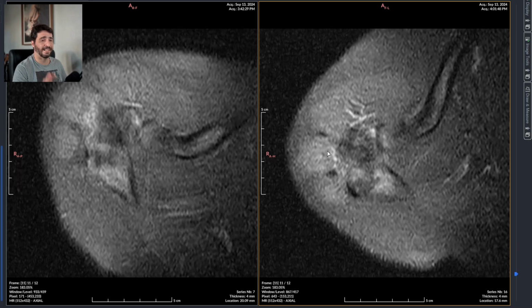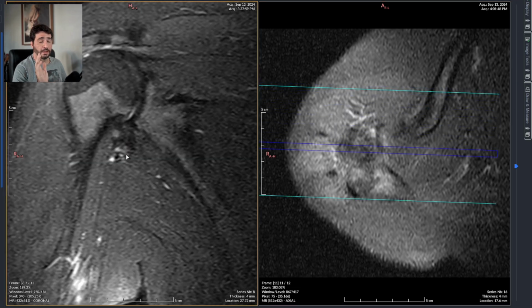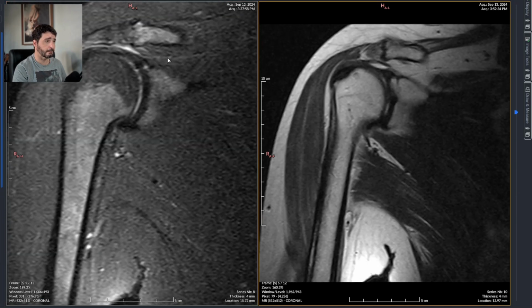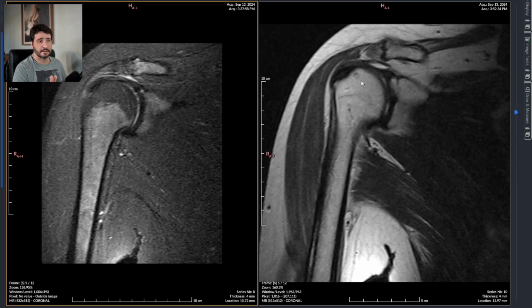So I have no signs of posterior nor anterior dislocations, no signs of fractures nor bone contusions, bone edema. So I can't really tell this patient has suffered any kind of major trauma that could be a reason, a justification, a motive for having a painful shoulder. So this isn't related to trauma as much as I can tell by just looking at these images.